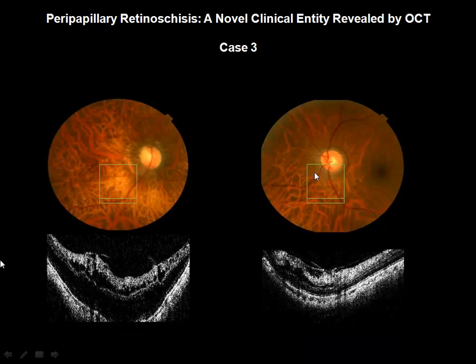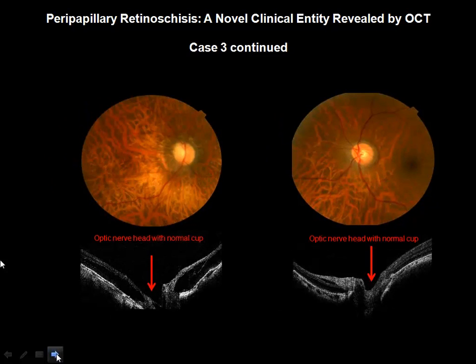And then if you do this in the other eye, it has to split only nasally, not temporally. This eye has reduced acuity, and the left eye actually shows 20/30 acuity. Both eyes have about -18 refractive error. Neither of these were picked up clinically. Couldn't see anything clinically.